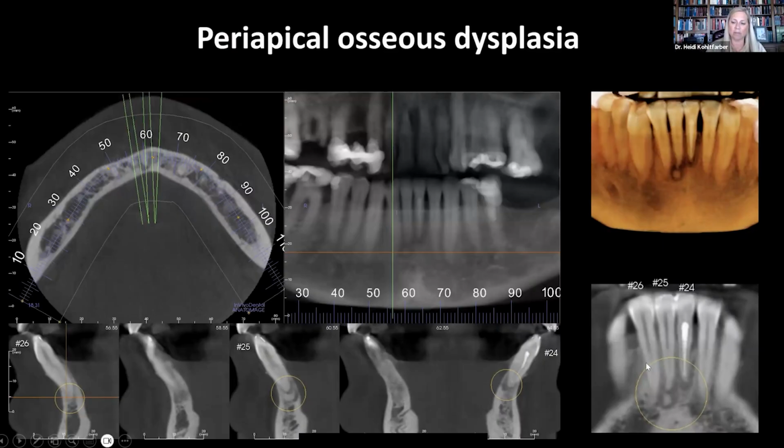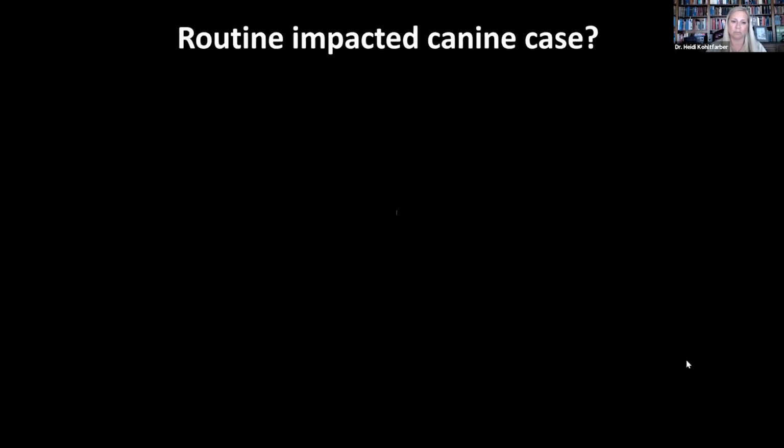And remember, your benign fibro-osseous lesions are more radiolucent in the immature stages, but these teeth should be vital. So we always want to do vitality testing. At this stage, this one's starting to become a little bit more mature, and we're starting to see that target shape appearance, that calcification, within the central aspect of it. Again, really make sure you're always doing vitality testing on the teeth. Many times we see multiple root canal treatments with these teeth.